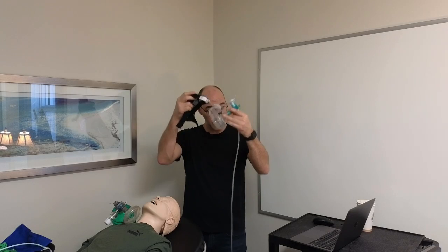So in addition to causing breathing effects, that change in intrathoracic pressure has cardiovascular effects. During inspiration, your diaphragm pulling down causes a negative intrathoracic pressure, and you can think of that as pulling blood into the core, so it increases preload of the heart. Additionally, as you create negative pressure, we actually decrease the afterload of the heart, and that causes increased cardiac output during inhalation. The exact opposite is true when we provide any positive pressure, whether that be through a CPAP mask like this one, or through a bag valve mask, which would typically be a higher amount of pressure that we'd apply.